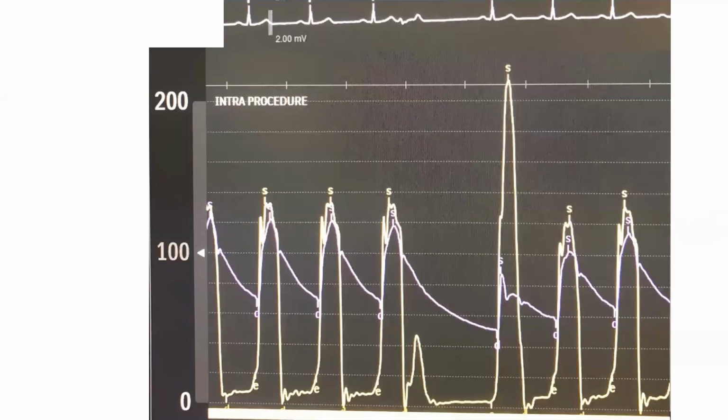This is another form of dynamic gradient. So this is a patient here. He's not having much gradient at rest. He has a PVC, and post-PVC, he has this. For a first-year fellow, what's this phenomena called? So what we have here is the Brockenbrough phenomena.